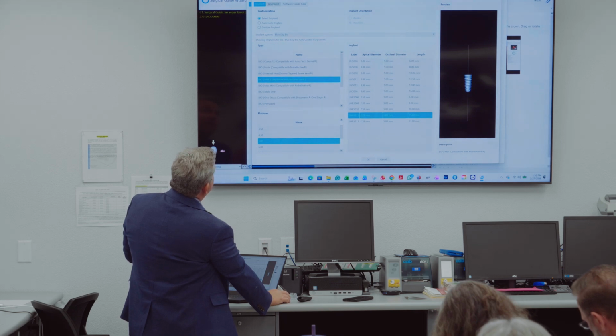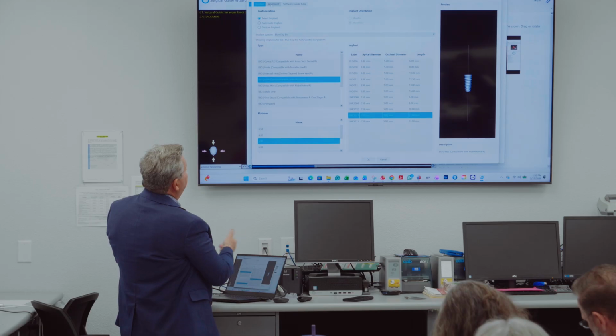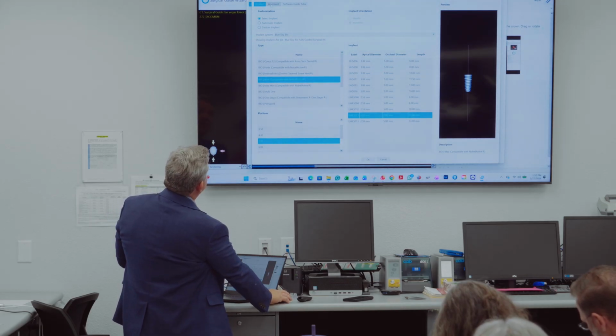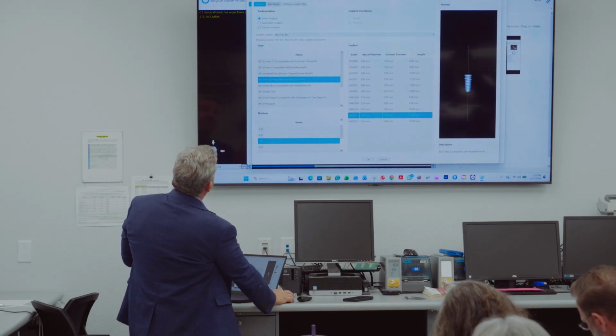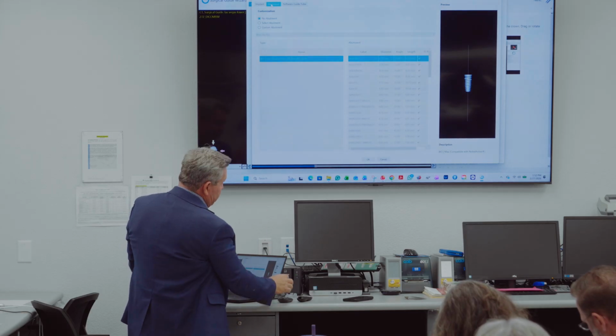Before you get out of this screen, you need to decide what kind of case it's going to be. Is it going to be a custom abutment? Is it going to be a tie base? Whatever, you need to choose that, because that's going to be important for planning the crown in a future step. So click on abutment. Follow with me here. No abutment selected yet.